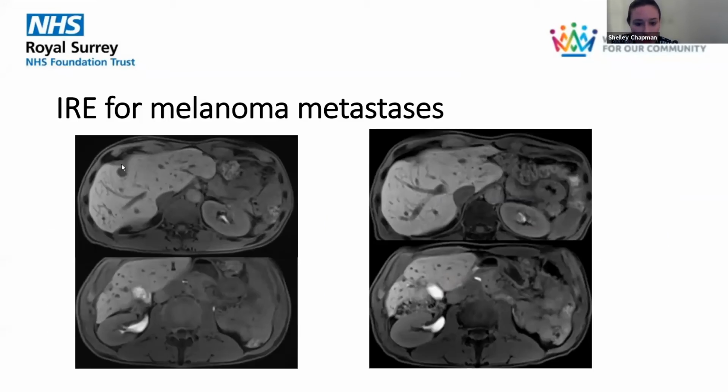So this is the before image of the more cranial lesion, and afterwards at 3 months you can see no lesion. And again, the lesion next to the gallbladder, you can see no lesion there. So a good success, well, short-term success for this patient who's still having follow-up.